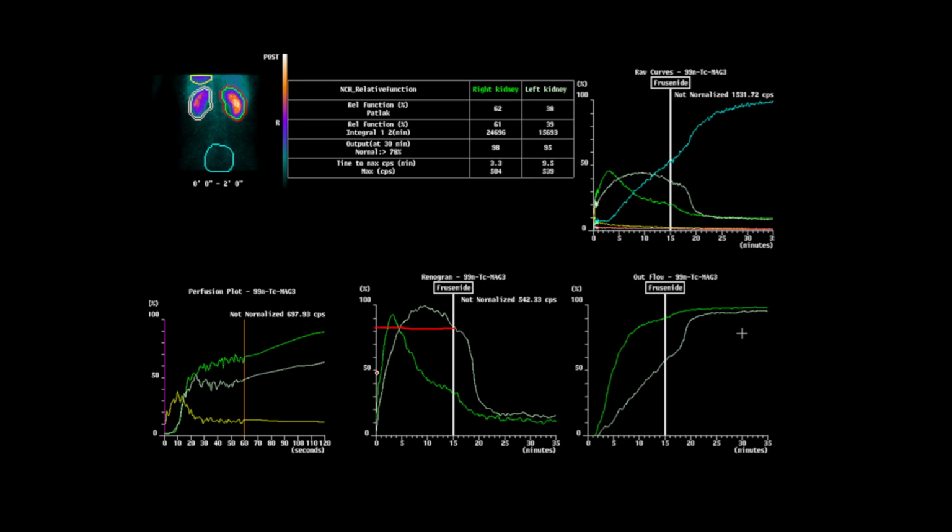So what have we got here? 50, 60, 70, 80, 90, 100. So that's 50, 60, 70, 80. So perhaps that's going to be 82% of the activity at this point. The maximum, the 100%, is the peak of the curve there. That's what it's taken to be. Because on this particular graph, instead of absolute counts, they're using percentages of the maximum count, and that's a way you can scale the graph. So you make best use of the available space by putting the highest point of the graph at the top.